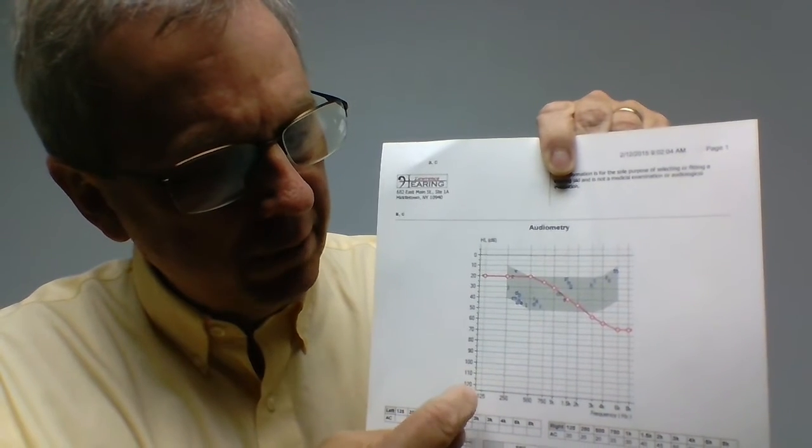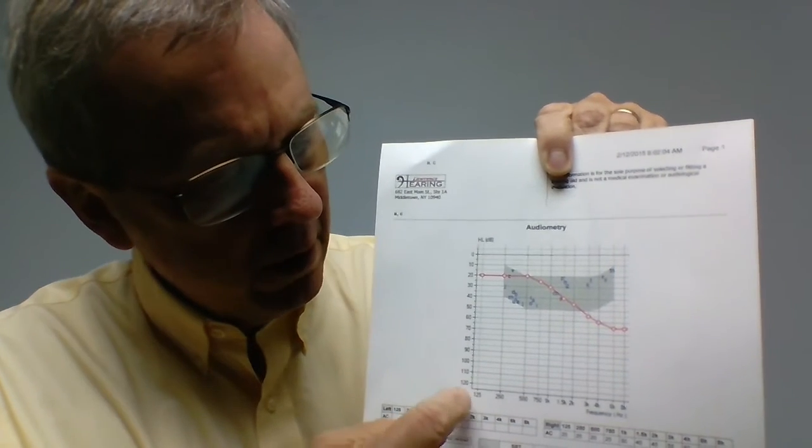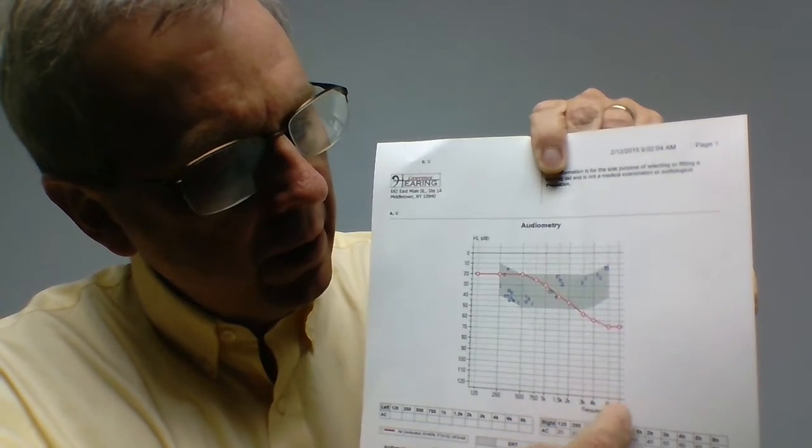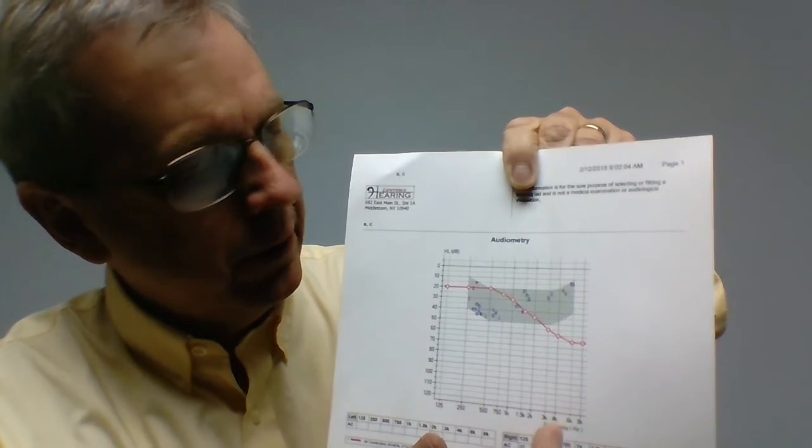So on this side of the graph, it says 125, you probably can't read it, but 125 hertz is a low frequency, like the sound of a foghorn, okay? So as we go across when we're doing the hearing test, the pitches get higher and higher until you get up to about 8,000 hertz. At 8,000 hertz is really the highest frequency we test. So I tell people that's like where birds chirp or the microwave beeps, those kind of high frequency sounds.